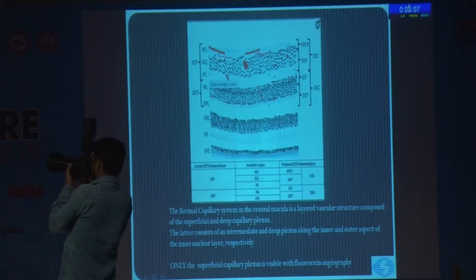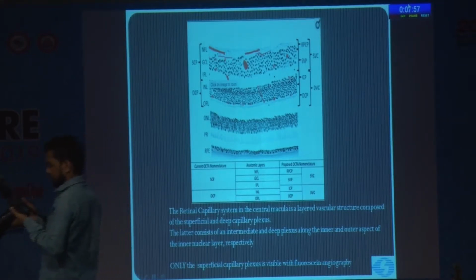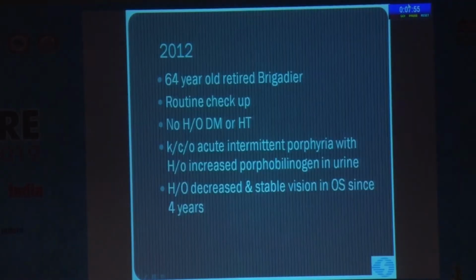Second point to be remembered is that any vasculature seen here in this avascular zone should ring alarm bells and should make us look out for some neovascular process happening. So these are two important points which we should remember as we proceed.